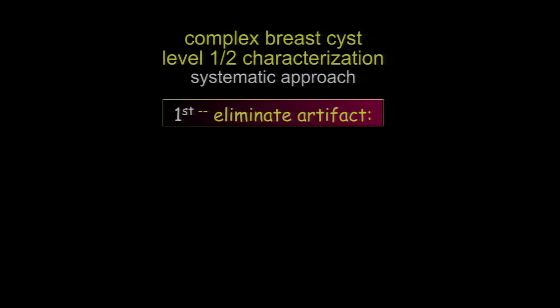This is a complicated cyst with low-level echoes and a thin wall. This is a complicated cyst with a little thicker grayer wall because of the apocrine metaplasia. And this one has an irregular thick wall with low-level echoes. So the one on the left simple, the two in the middle are complicated. The one on the right is both complicated and complex, but just like solid nodules, when we see a mixture of more suspicious and less suspicious findings, we go with the more suspicious findings, so we call it complex.